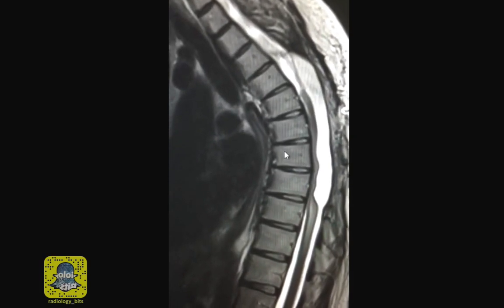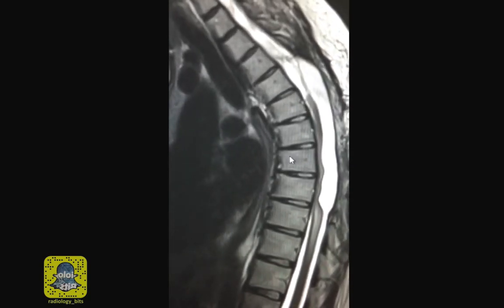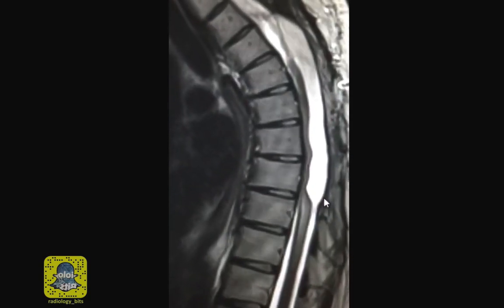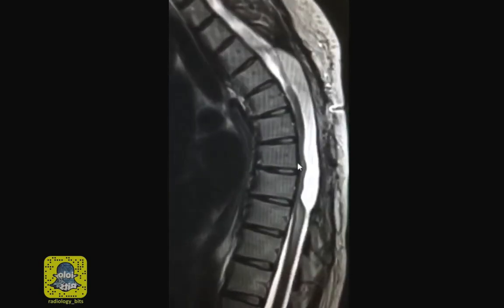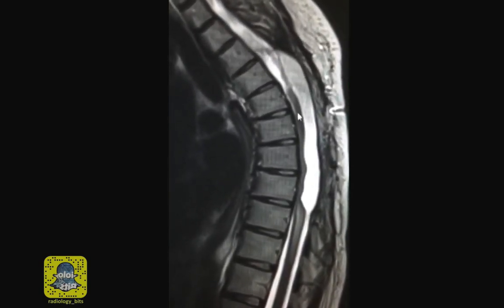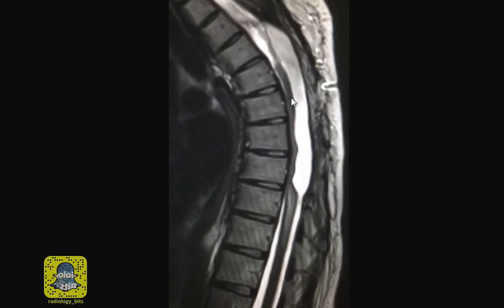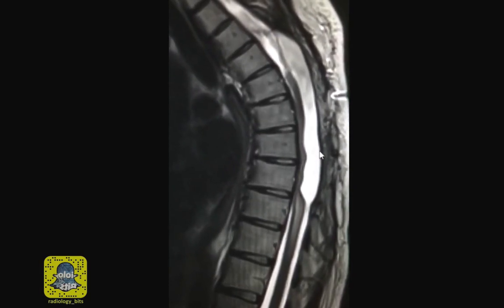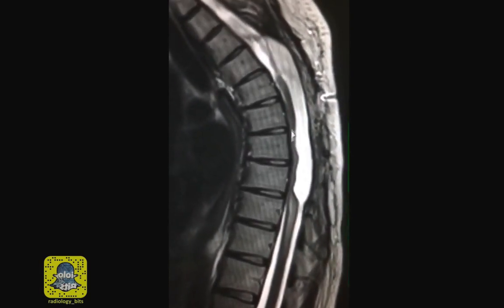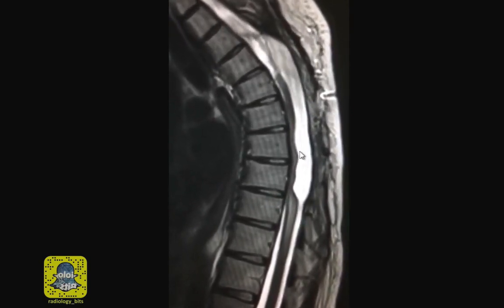So let's summarize what we talked about. We started by simple anatomical facts, and we emphasized the location of the abnormality within the spine. Abnormalities within the spinal canal could be divided into intramedullary, extramedullary intradural, and extradural. We showed a classic entity of anterior cord herniation where the cord is displaced anteriorly without CSF space between it and the vertebral bodies. The anterior displacement is classically abrupt, and there is expansion of the CSF space posteriorly. Anterior cord herniation could be associated with changes in the cord and myelopathy, and may be idiopathic or a result of prior surgery.